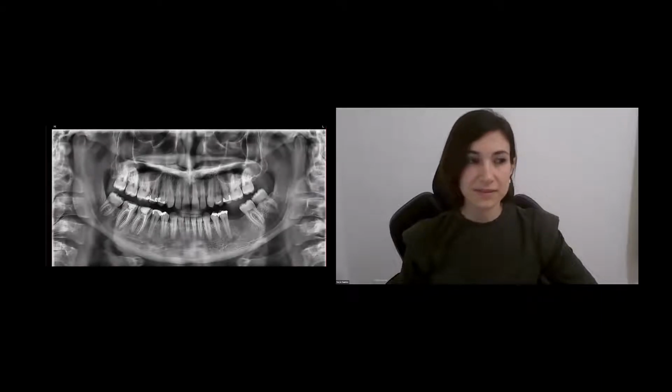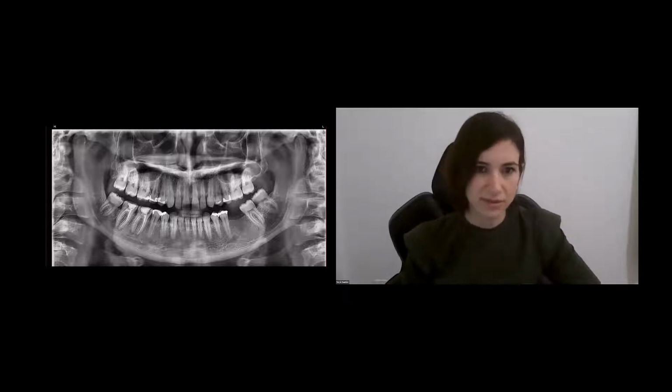However, there are a lot of areas that are not shown on a panoramic. And when you acquire a panoramic radiograph, there are so many superimpositions, and some of the structures are even projected in another location. So all the central structures, such as the C-spine, the hyoid bone, the airway, are projected bilaterally.